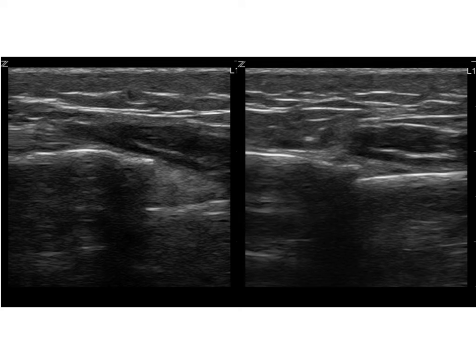How about this fracture reduction? The pre-reduction is on the left and the post-reduction images are on the right. So first, we identify the hyperechoic smooth bony cortex and see that in both cases there is a disruption of it. That being said, the disruption is far less in the post-reduction image than in the pre-reduction image.